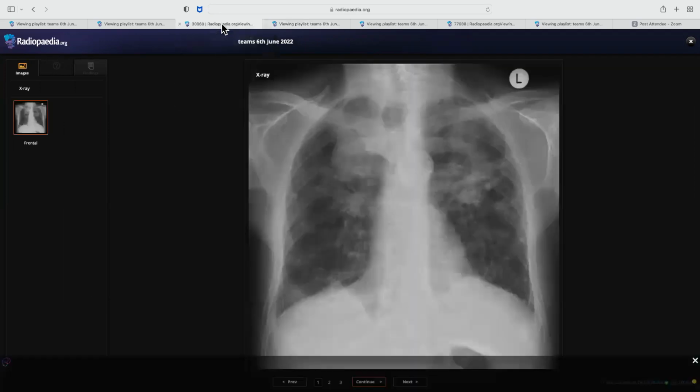And then this was progressive massive fibrosis, as you very well said. You also mentioned that we should look at the previous images, which was good, because in that case, they will show you the previous image. Unless you ask, they will not show. And when they show, in this case it would be the same. So that would confirm the diagnosis. And there are no acute symptoms in this case.